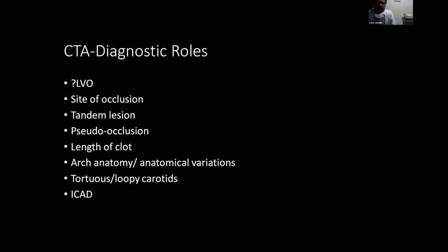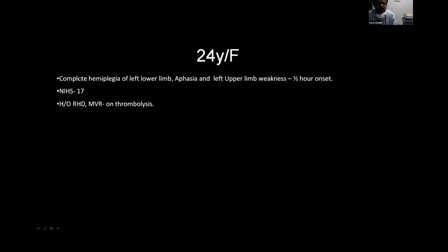So much about technical points. Let me come to the main area. So I said the diagnostic role is, whether there is a large vessel occlusion or not, CTA will instantly tell you. Followed by a plain CT, we complete a CT angiogram typically in 3 to 5 minutes. This will give instant diagnosis in these areas. Let me illustrate with some cases.